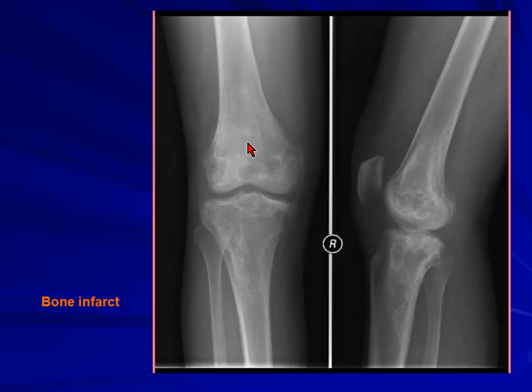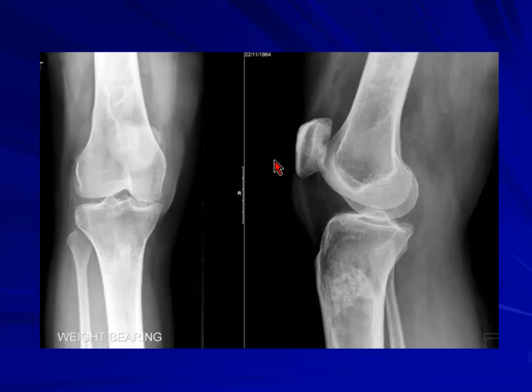So either the patient is sickle. In sickle, you can have this typical appearance in the metaphyseal region of the proximal joints, in the periarticular region. I don't know the history. So again, these are bone infarcts here and here.